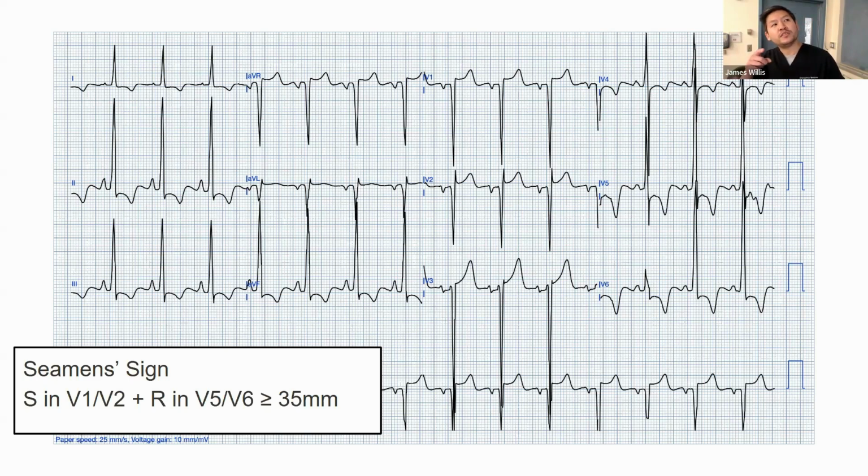One important thing I forgot to mention in that study, they looked at EKGs like this. There are 12 leads and 1 rhythm lead. When you get the printout, that's what it looks like. But when you look on Muse, it auto switches to 3 rhythm leads and squishes it together, and you can't use that. You have to switch it to 1 rhythm lead, or you'll overdiagnose LVH.